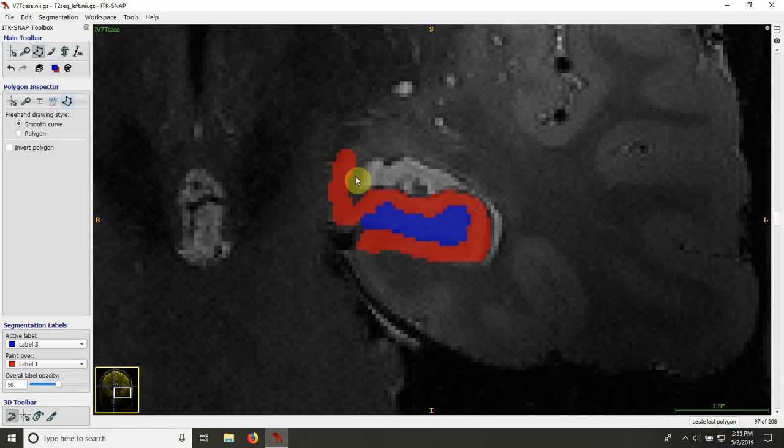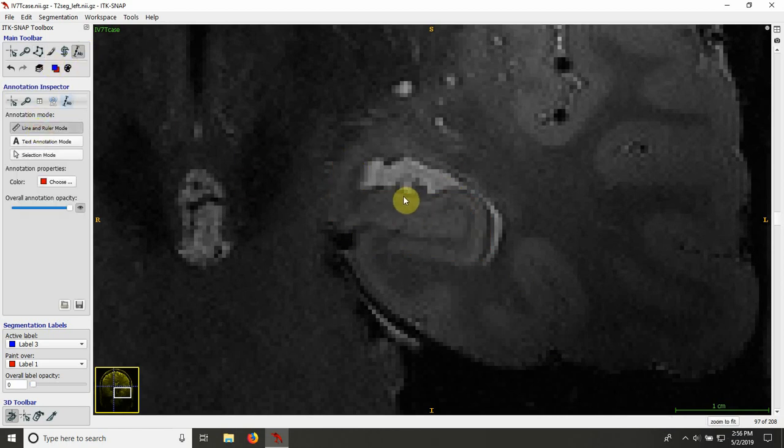And in cases where it can be hard to find, it can be helpful to infer, for example, thickness of adjacent locations. So for example, the thickness of the gray matter is about this width, so I'm expecting it to be a similar width very close by. So that's why I think this is probably all alveus, or SRLM voxels. So that's why I think this is the outline.